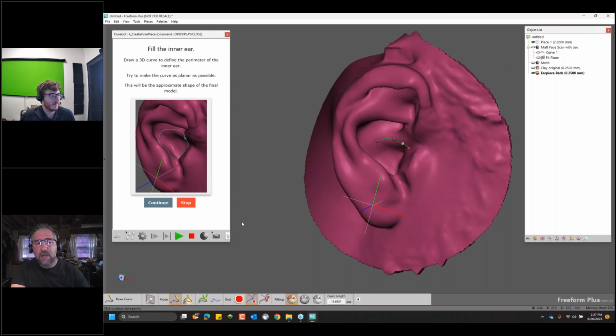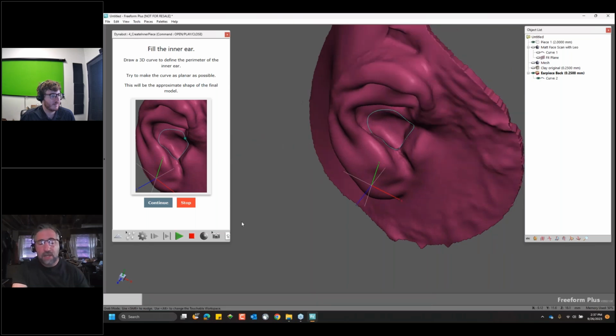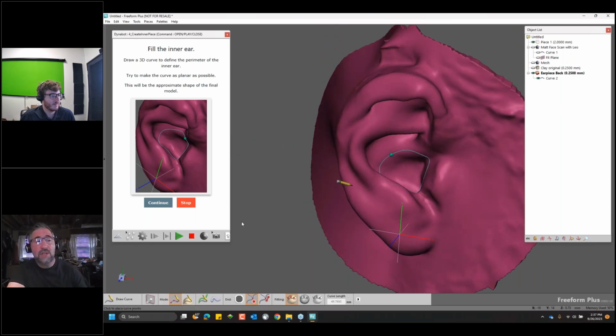All of the tools are swapped behind the scenes. Everything is pre-configured. So all I have to do is follow some simple instructions and do what it is that a human is good at, which is look at the data, determine the landmarks, look at the things that are going to be specific to the patients. And that is the type of thing that you can't easily teach a computer to do. But if you simply pause the tedious work and get the input from the user, the computer can do all of the things that I don't want to do, and I can do the things that are important.